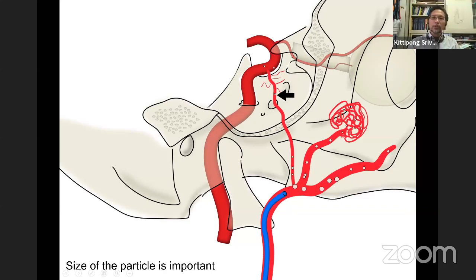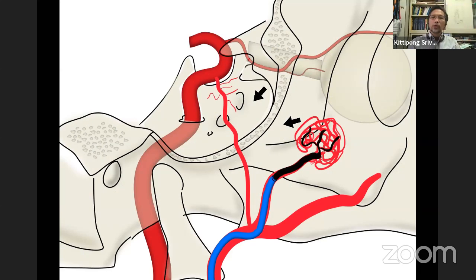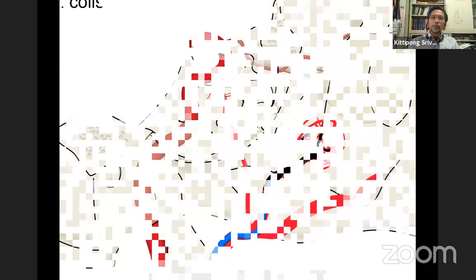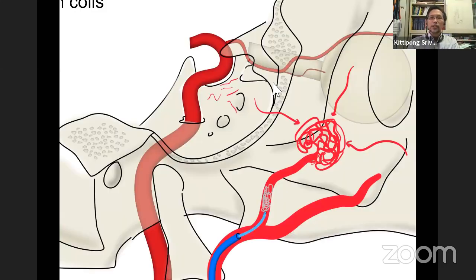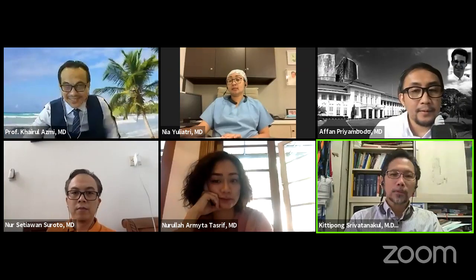I have shown you the connections, okay? So you want to go closer to put anything there. The closer, the safer, of course. But if you reflux, you can enter anything, okay? And there are still connections, like very small ones over here. And if you put coils, I don't know, it's not working properly. If you put coils too proximal, you'll be safe. So it's either you're safer or you're less efficient, okay? I don't know, the slides are not working very well. Anyway, just to add on to that.